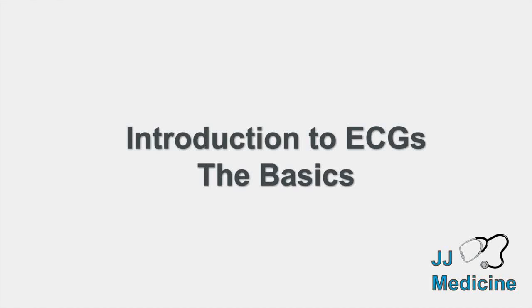Hey everyone, this is an introductory lesson on ECG. So in this lesson we're going to talk about ECG paper and how it's laid out. We're also going to talk about the PQRST wave, talk about what each of those waves actually means. And we're also going to look at a method of reading ECGs and look at how we can determine heart rate, rhythm, axis, and intervals from an ECG.